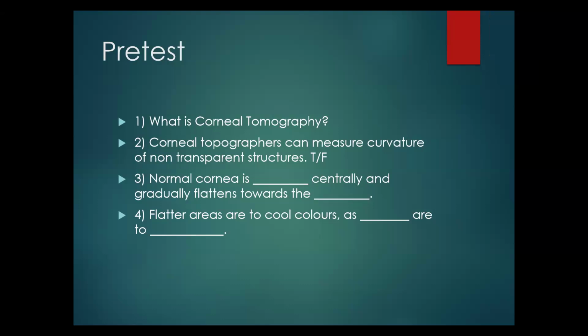Okay, thank you. But I know most of the maps cover essentially four aspects of the cornea: thickness, curvature, elevation, and power. Which of them do you think is captured under tomography out of these four? And of course the Pentacam does the BAD analysis.